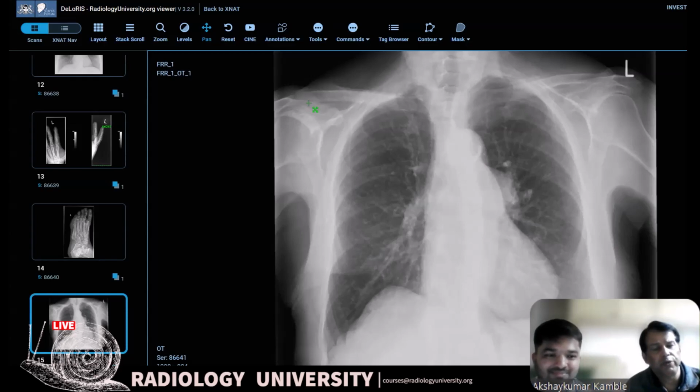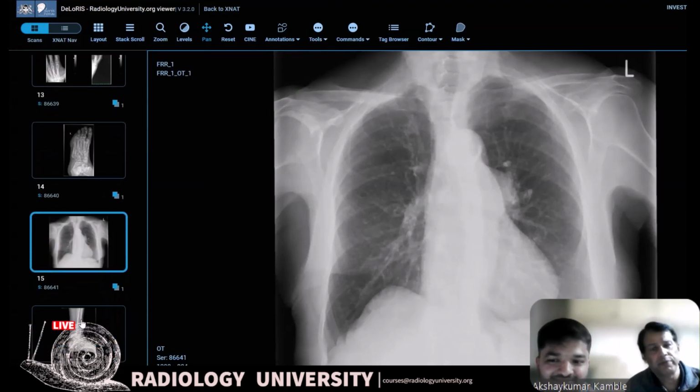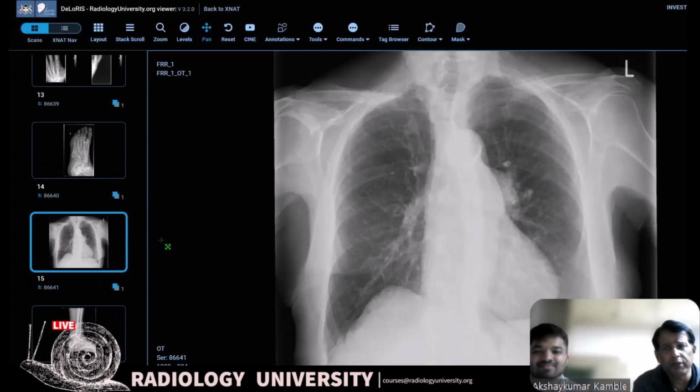But in college, for the real exam, there will be only one abnormality which you can describe. But for this type of course, even if there are two and you write one, it will still allow you to get marks. So you got it abnormal. Well, that is right. You got full marks on that. It just happened to be two pathologies in this. Yeah. Okay. So it's an abnormal film.